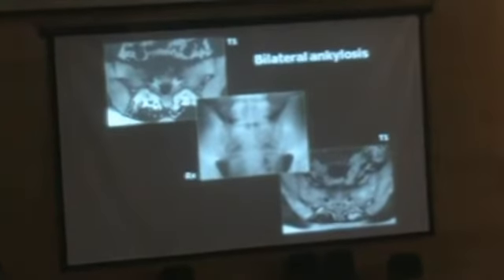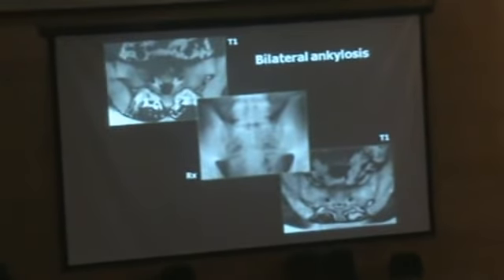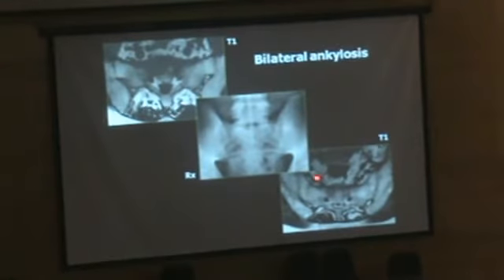And this is an example to show you the end stage. This is very easy to diagnose, but no one wants to diagnose the patient at that stage. This is very bad. This is a stage at which all these drugs, we know, won't have any more effect on the natural history of the disease. We want to diagnose those in the other slides I showed you, when we see the very early stages of inflammation. So this is ankylosis. We don't see the sacroiliac joints anymore, and you can see on the MRI as well areas of ankylosis, meaning fusion of the bone, so we cannot see the joint space itself very well.